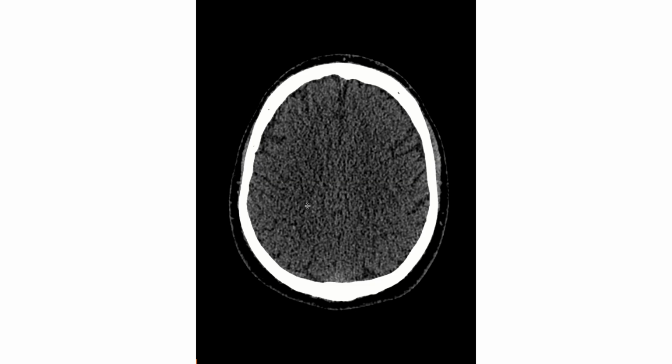to teach you how to look at a simple head CT. So if you're a medical student, or even if you're not a radiologist, like a neurologist or other specialty working in the ER, and you want to know what specific things you have to look for on head CT, I'm here to tell you what the important windows are and what the important structures are that we have to look at on every single head CT.